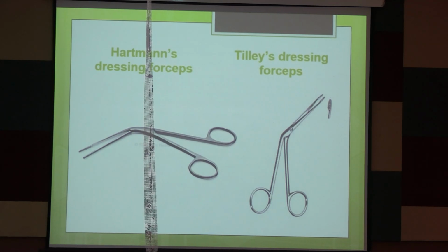But if you are asked about one use, that would be in the nose, in nasal packing and nasal surgeries. What are the nasal surgeries? All the surgeries, septoplasty, SMR, right? All the surgeries we use it, okay?